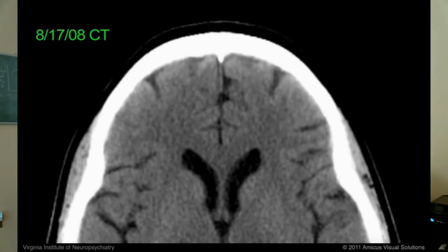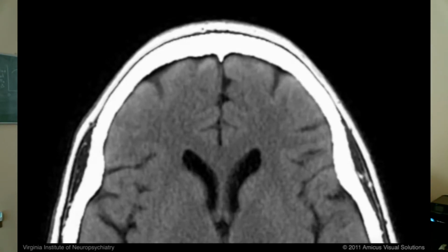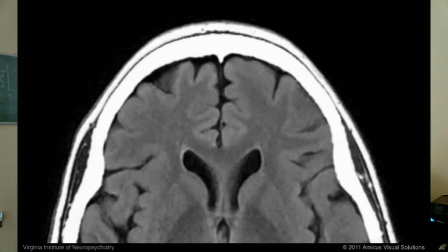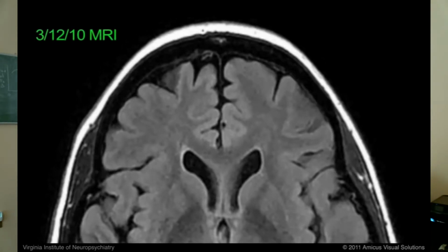But when Michael Havranek did the morph movie, and we play it here, you can see as you watch it change over time that the right frontal lobe atrophies, that is, it shrinks. So it's much easier to see the change over time, and that's the point we're making here.